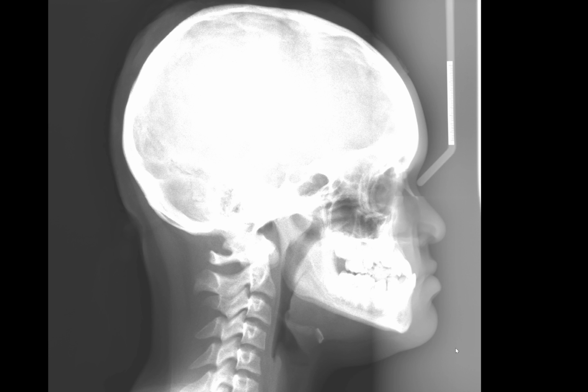Right? This area should be just air, so it should be dark, radiolucent, but it's relatively fairly radiopaque, even though we're imaging just air. So what's the explanation for this appearance?